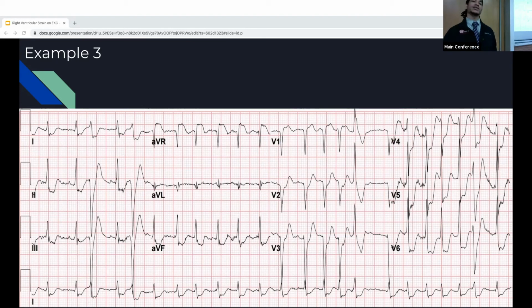Good, I like that. So some ST elevation in AVR, that's what we discussed in the 2017 Journal of Emergency Medicine study. They just kind of mentioned in the discussion that ST elevation in AVR may be right atrial infarction, maybe a sign of PE.